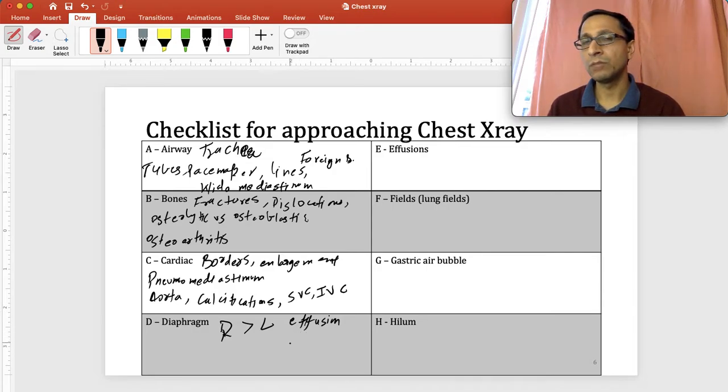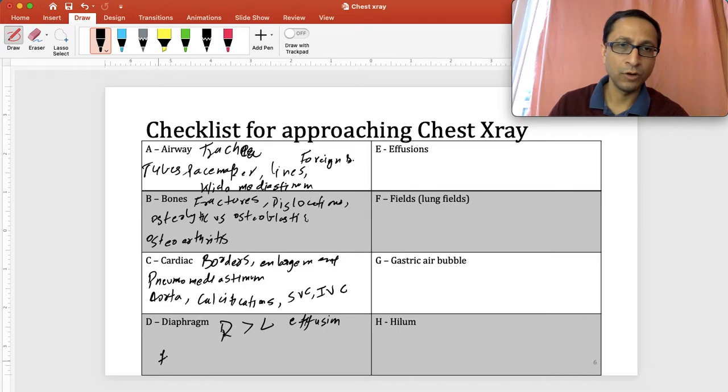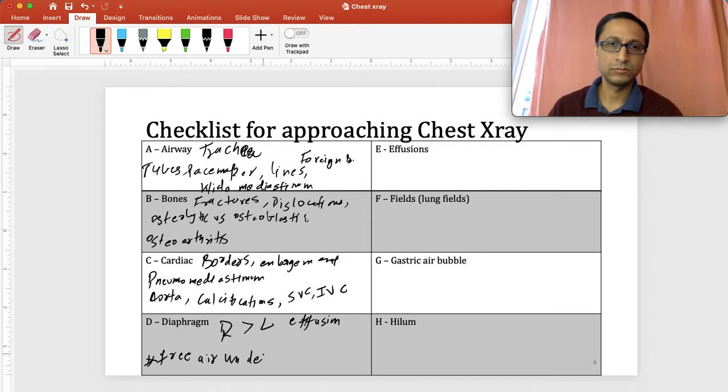And depending on what else they're presenting with, if the patient presents with sudden onset acute abdominal pain and they are in the ER, look for a very, very important finding. This is tested in multiple points, multiple questions. We call it free air under the diaphragm. And this one suggests a perforation, a GI perforation.